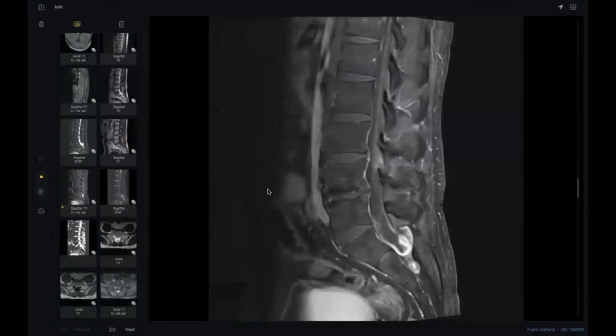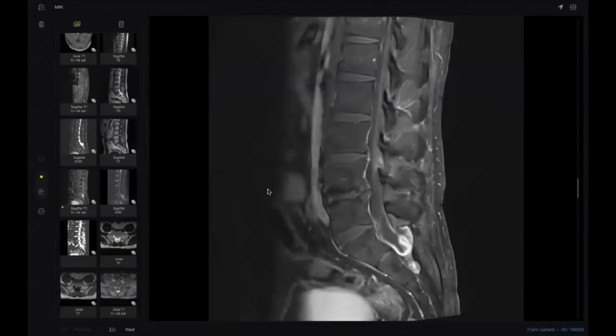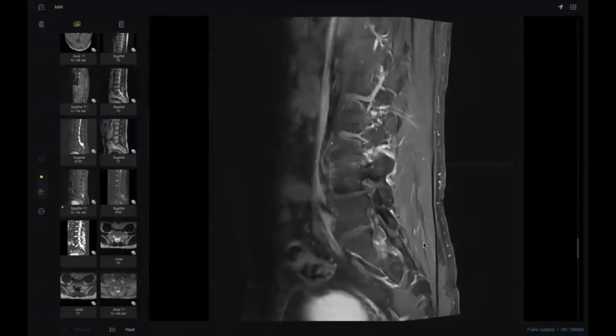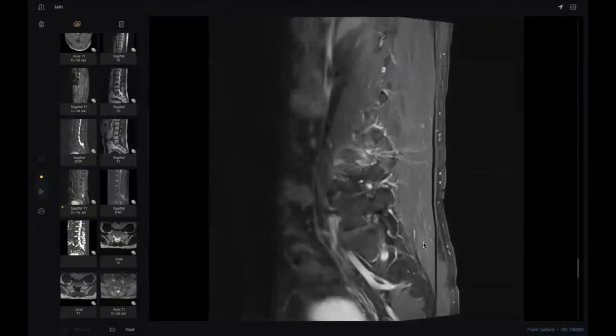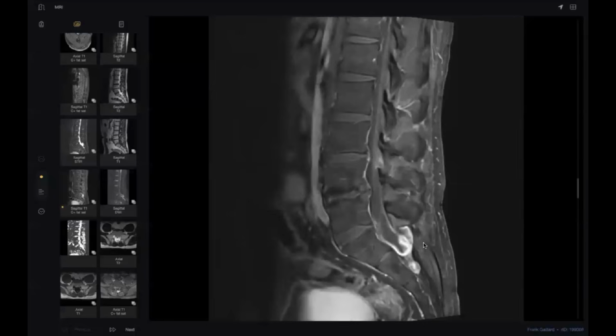But here, very obvious. When you have a tumor in the upper cord, the cervical cord, and then you have something enhancing here, don't tell the examiner it is highly suspicious. No, it is a metastasis until proven otherwise. Okay, my colleagues, is it clear?